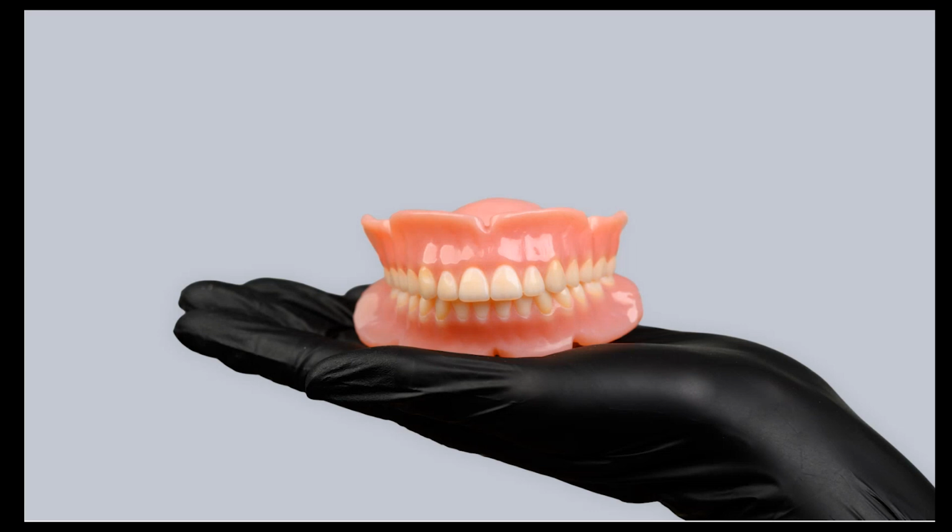There isn't a difference between the voxel shades and the basic shades, as long as the teeth are separated and get the same analysis and the same process. So 3MF is supported the same as OBJs. Yes. The only requirement is to have the teeth separated.